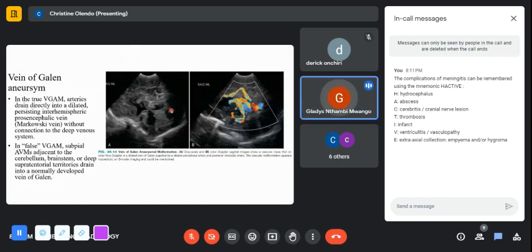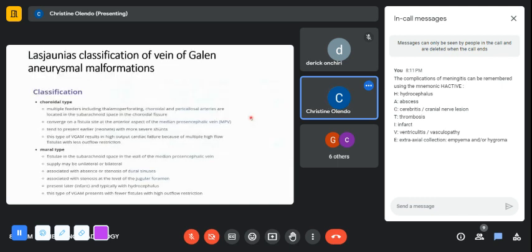So whenever you see a cystic lesion, you have to put Doppler, because it could be a vascular malformation, in grayscale imaging. So when they did the Doppler, they could see the cystic lesion is filling with flow. So for this one, we're seeing communication of the callosal and the posterior choroidal arteries draining into what was seen as a cystic lesion, which was now the vein of Galen.